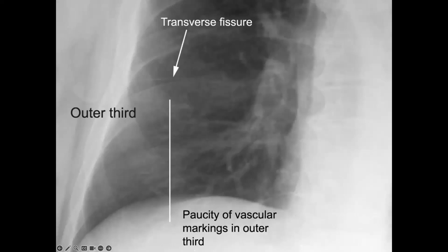If you're able to see a fissure with ease and the image is not zoomed in like it is here, likely there is either a small amount of fluid in that fissure, allowing it to be visualized, or there is some degree of scar tissue or inflammation present. That's the only time really you'll see a fissure.